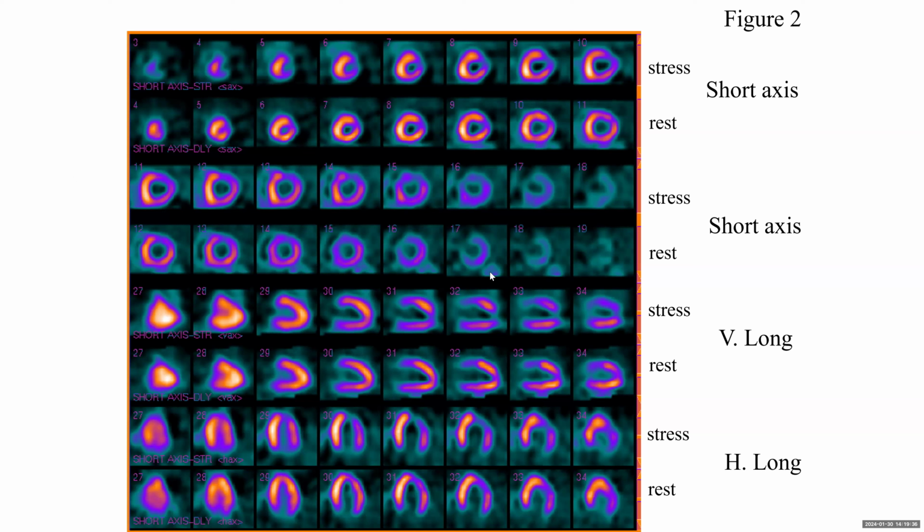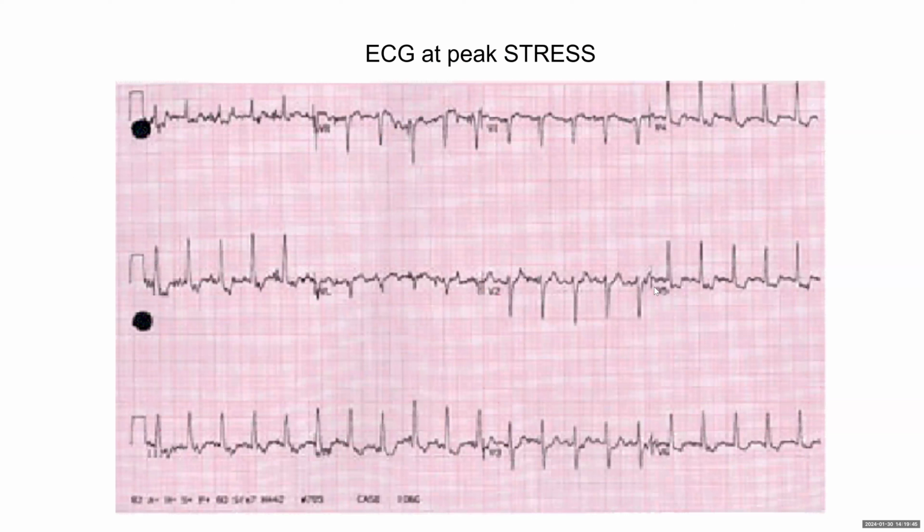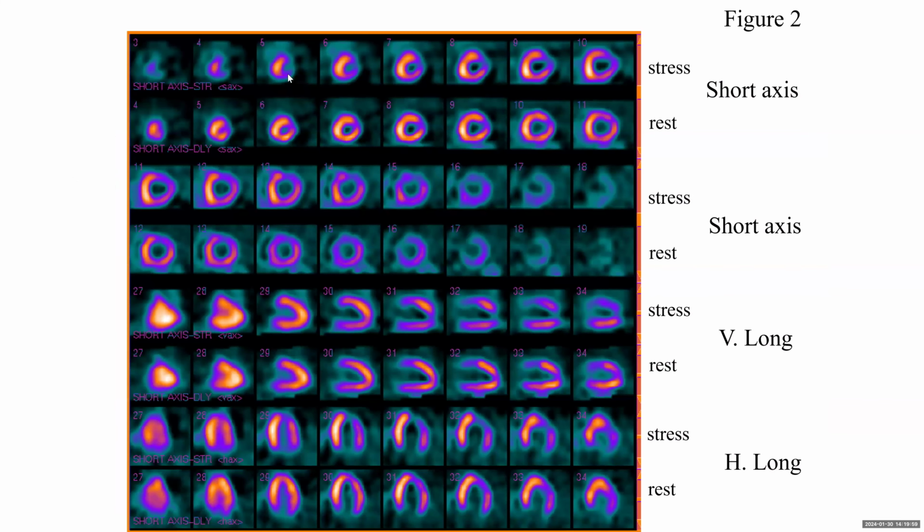So this patient has probably intermediate risk prior to the testing. Upon the stress test, as you see, he developed a downsloping ST segment depression of at least 2.5 millimeters in several leads. And he did not have chest pain. However, when we look at his perfusion scan, there is a large area of reduction in the tracer uptake in the anterior and anterolateral wall, entire anterior anterolateral wall, consistent with ischemia in the LAD territory. And there is possibly a TID.